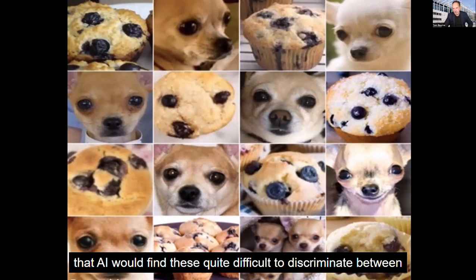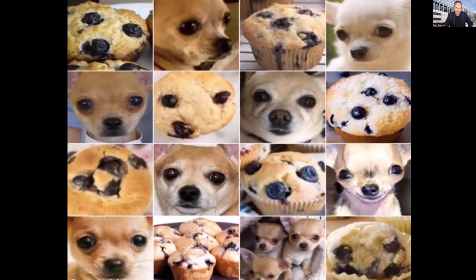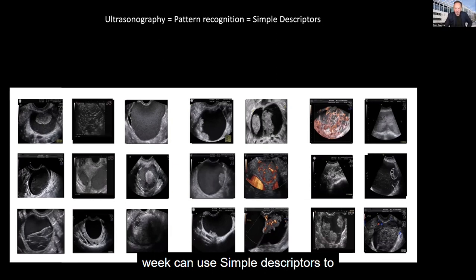And if we went to an AI algorithm, we'd probably find that AI would find these quite difficult to discriminate between. But of course, because you are humans and you're very used to seeing faces, you've got no problem doing this. And that's because of familiarity and the way cognitive theory works, if you like, that you don't have to even think about it, you get the answer right. And that's actually the case with some ovarian masses. Because when we look at ovarian masses, some we can recognize with pattern recognition, some we can use simple descriptors to get the right diagnosis, in others we need more help.